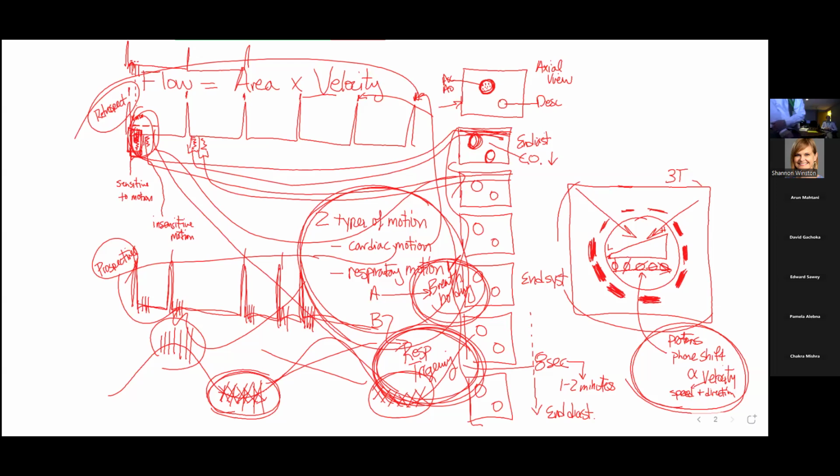All right, let's go to new screen. Thanks, Corey. So let's go back to now our aorta. Here's our aorta here. Here's the descending. Remember, we have the axial image.